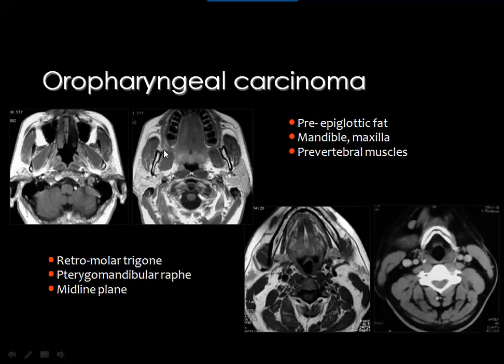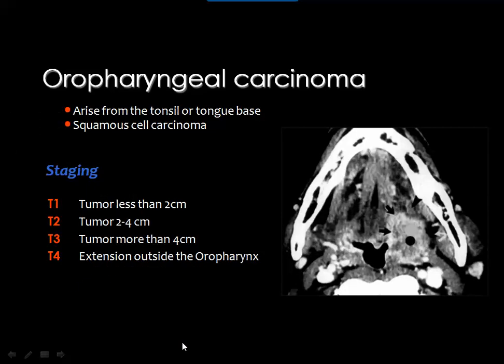Here, this is the pterygomandibular raphe, and you look if it is invaded by tumor or not. Then one of the important issues, especially in the tongue and mouth floor, is to look for the midline fat plane, if it is crossed by the lesion or not, because crossing of the fat plane by the malignant lesion means that surgery almost cannot be performed.